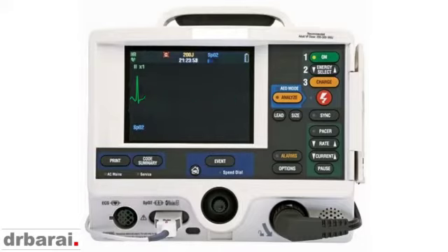This is another non-shockable rhythm, which needs to be treated with IV adrenaline 1 mg, 1 in 10,000 dilution, followed by CPR. Every alternate cycle, we should give adrenaline 1 mg, 1 in 10,000 dilution, IV rapid push. So again, the ECG pattern might look pretty normal, but we need to correlate this with the patient. Is there any pulse? Is there no pulse? If there is a pulse, that's great. If there is no pulse, this is pulseless electrical activity.